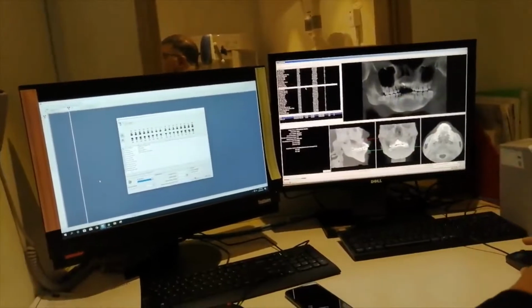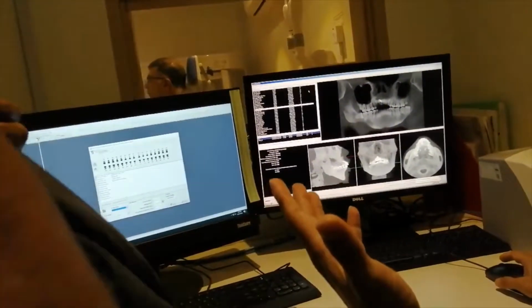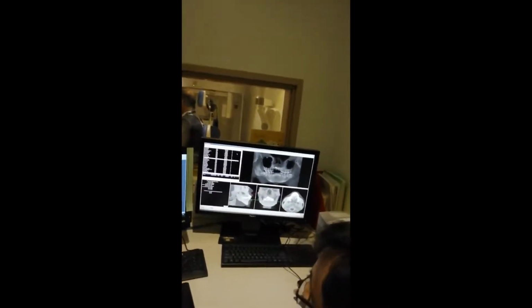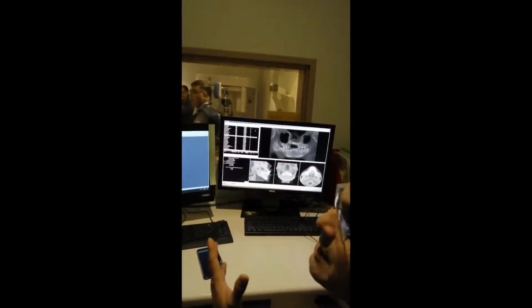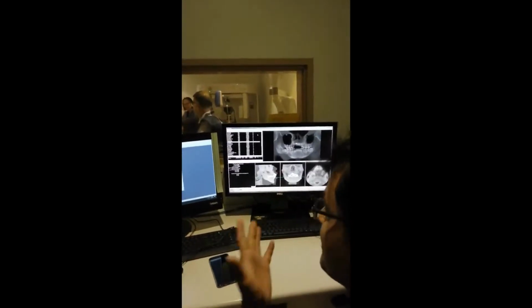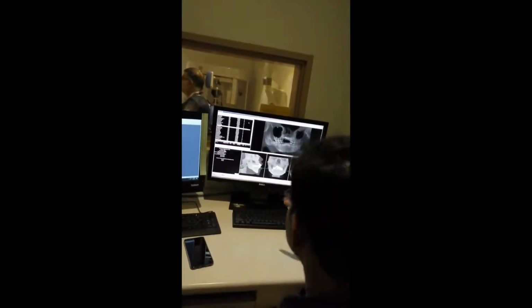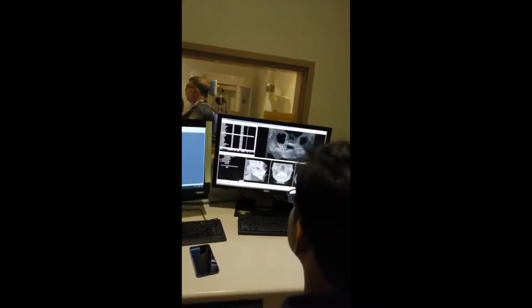Anyway, to place the implant, how much bone is available? And whether we are safe from the nerve, meaning your implant should not be touching the inferior nerve, right? For all those things, a CBCT scan is a must for implant. Otherwise you can place, but you are just imagining whether you are safe or not. This will give an accurate picture. Fine. So how to go for this?